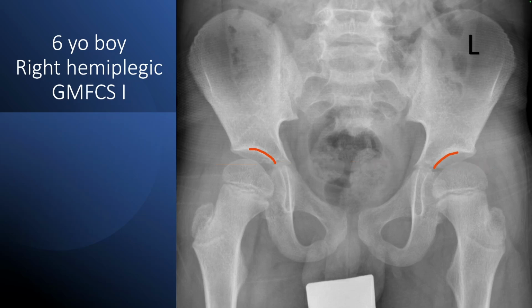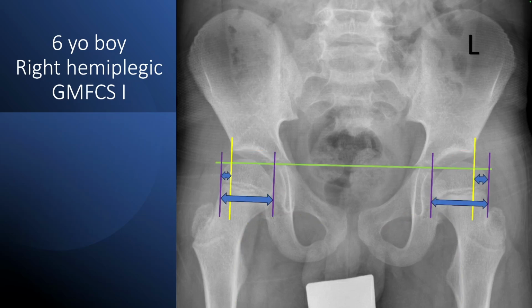The acetabular roof bilaterally is well developed with a normal contour and a distinct and sharp lateral corner. The medial joint space is not widened, and the joint space is even around the head, indicating concentric reduction. Shenton's line is intact, also indicating the hip is sitting in good position. When migration percentage is assessed, it is confirmed that much less than 30% of the head is uncovered laterally.